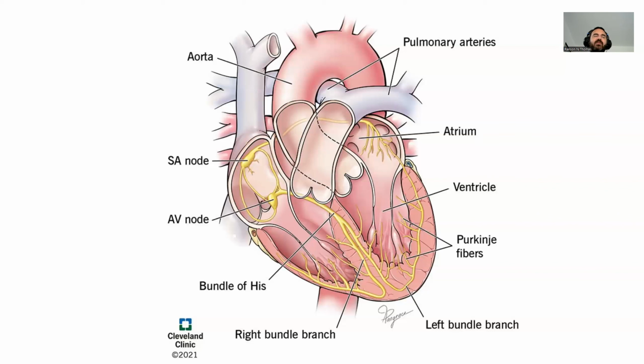I'm going to mention a couple things, and I'll probably mention it again as we go on because repetition is how you learn stuff. But effectively, we have a P wave, what's called a QRS complex or a QRS wave, and then a T wave. There's a couple different ways you can think about those waves, but one way is to think, okay, the P wave is the SA node firing, more or less, right? The QRS complex is the signal going through the AV node and hitting all the Purkinje fibers and everything, right? And then the T wave is the heart kind of resetting, right?